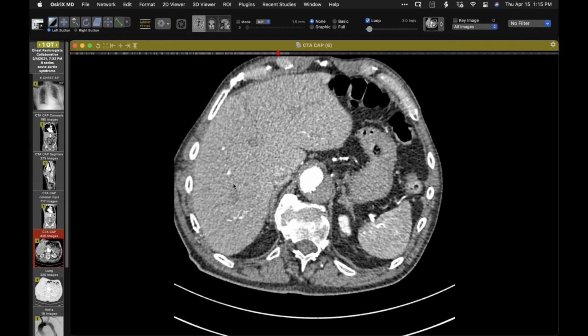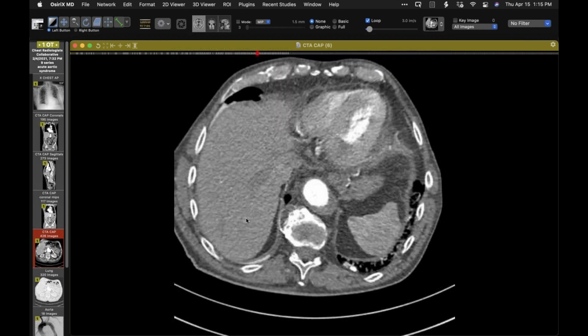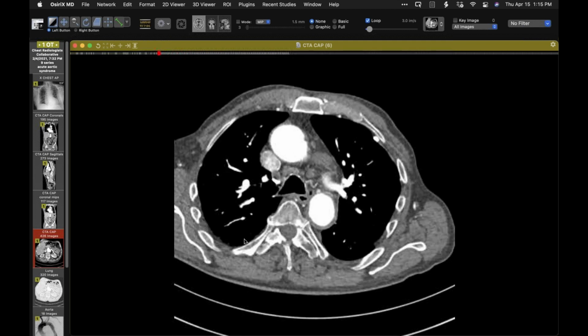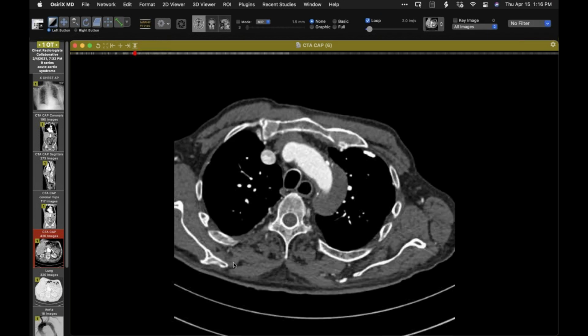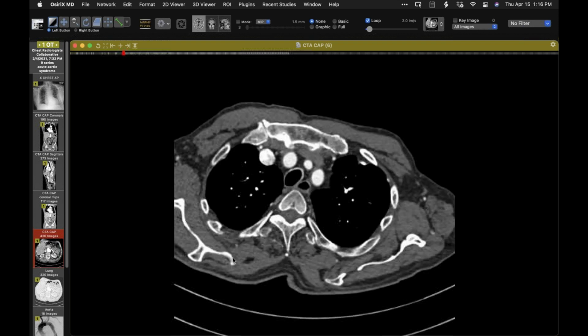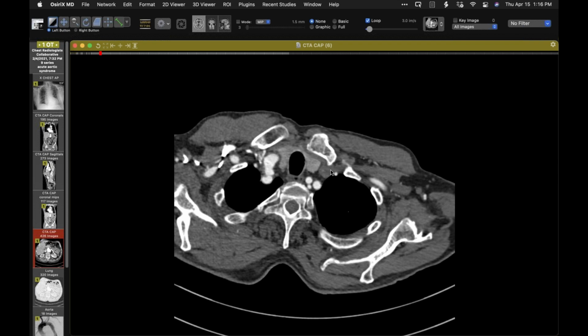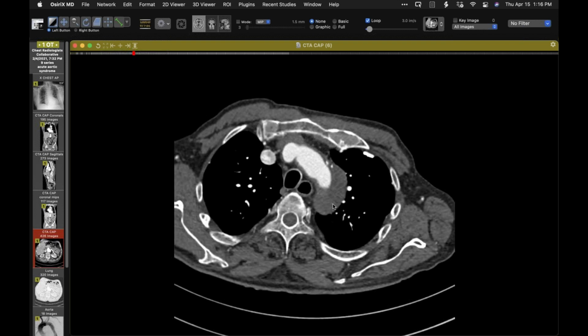Yeah. This one I'll show you and see what you think. So this patient, in summary, came to us from the outside because we have surgeons that do the complicated acute aortic syndrome cases. At the time I saw it, I got the impression that the surgeon here accepted the diagnosis that came along with the patient of penetrating atherosclerotic ulcer with IMH, intramural hematoma, and they proceeded to treat the patient, as you'll see, with a stent. I don't think that they got a second opinion from anyone here, but I think they just acted upon the information and the report that they had.